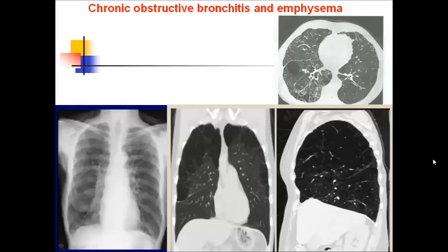And this is just an example of chronic bronchitis with deformation of lung pattern with the absence of the lung pattern in the peripheral part of the lungs, and formation of huge emphysema bullae in the lungs in frontal and lateral projection. The same is on the axial slices.